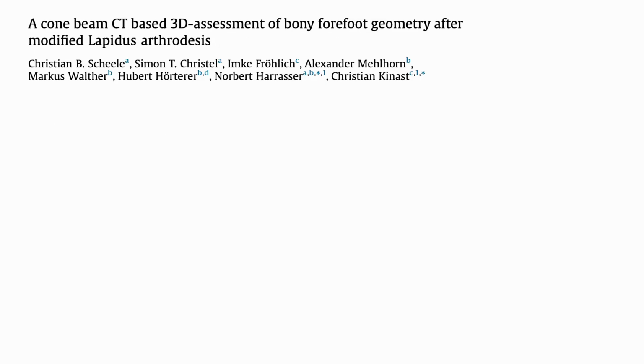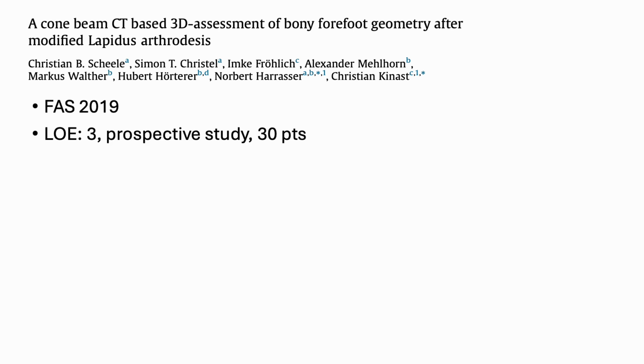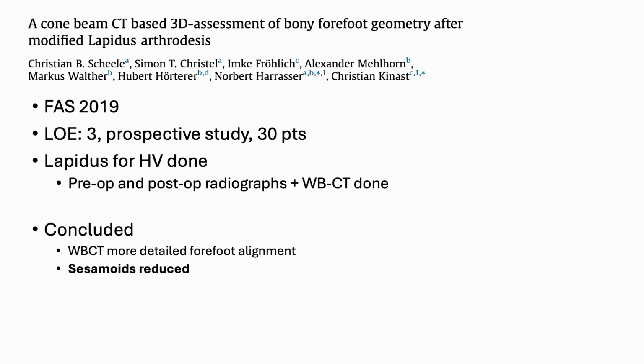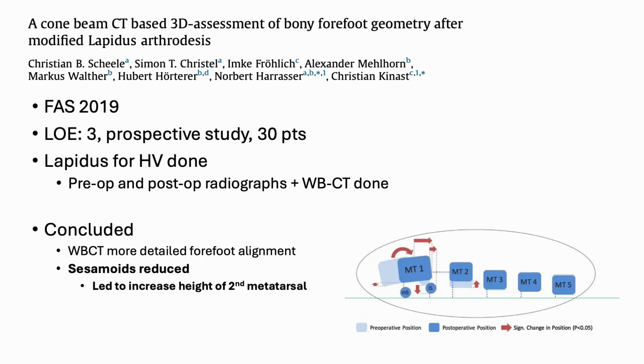Overall, here's a pretty good study using weight-bearing CT scan after doing a Lapidus type procedure. 2019 level 3 study, Lapidus done for hallux valgus. They did pre-op and post-op radiographs and a weight-bearing CT scan. They concluded that weight-bearing CT scan gave more detailed forefoot alignment. They noticed that the sesamoids were reduced after doing a Lapidus procedure, which led to an increased height of the second metatarsal. This is kind of a diagram of what they showed after doing a Lapidus.